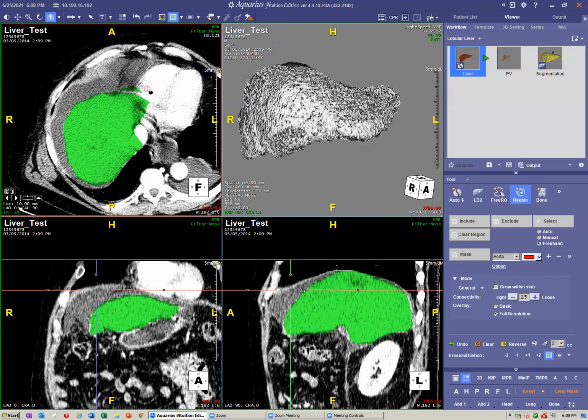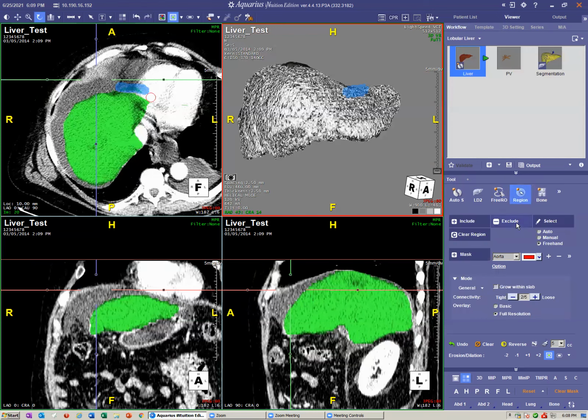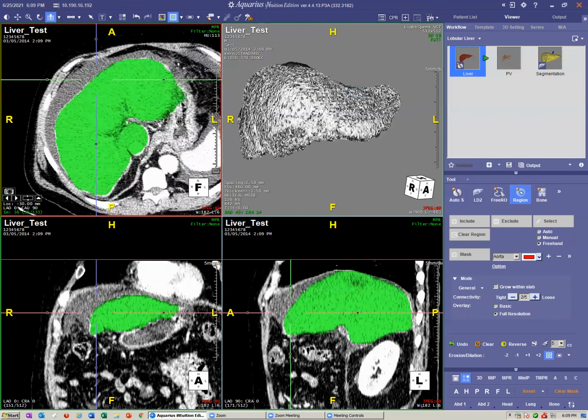Here is a red circle that will represent what I want to highlight, like a marker essentially. You can shift and scroll wheel in whichever direction to increase or decrease the region of interest you want to apply. Let's say that's what I settled for. You can hold down shift and then hold down left click to highlight the areas you want to exclude. So that's what we bled out.